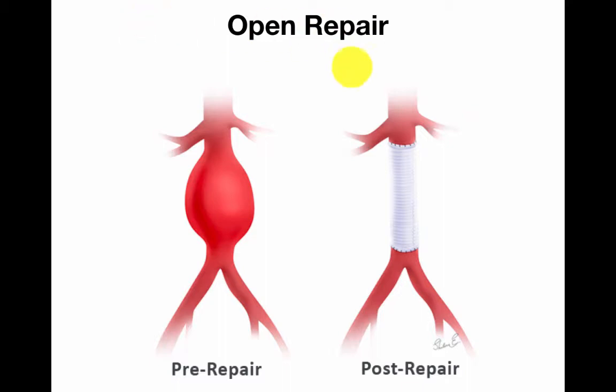You can see over here they've got these little suture lines in there, so the vascular surgeon sutures like crazy, makes sure that there is no leak from the graft, and that is that. The repair is done, and they have essentially replaced the aneurysm sac with the graft.